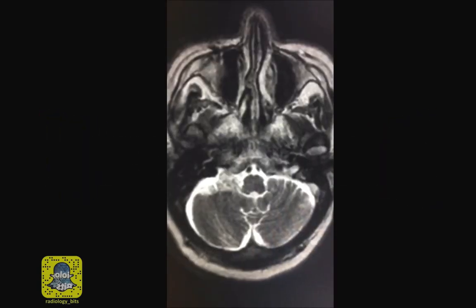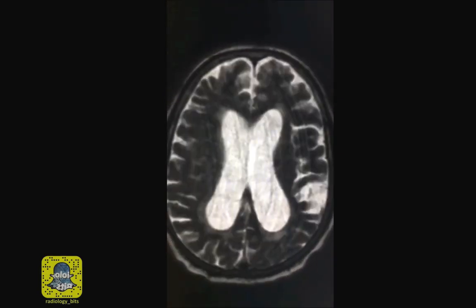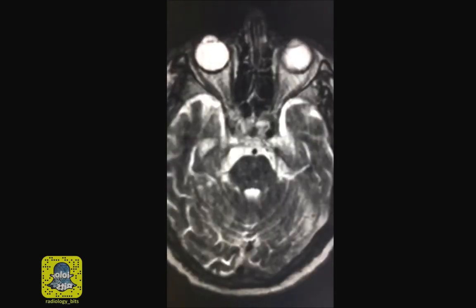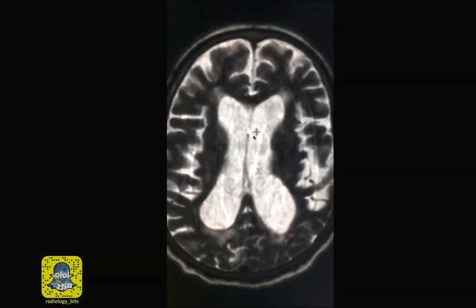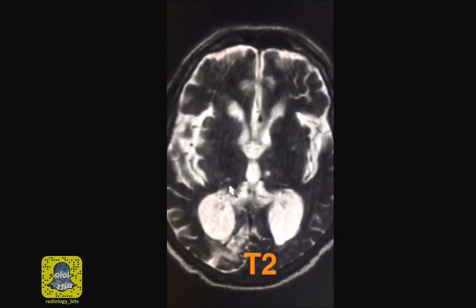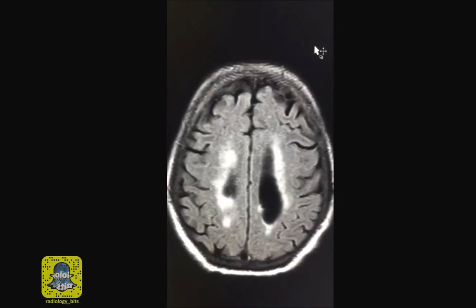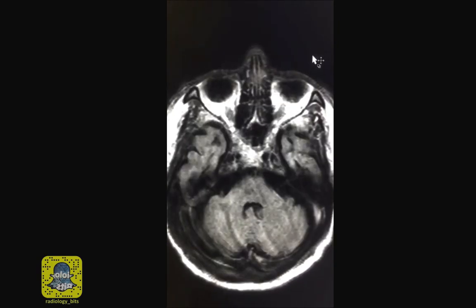This is an MRI on an 80-year-old male patient who presented with dementia. As we learned from prior sessions, this is the ventricular system, which on such a T2 weighted image appears bright. So this is a T2 weighted image showing CSF spaces, whether in the ventricle or outside them, as bright on T2. To make things easier, you could look at this image here, which is also a T2 image with a twist.